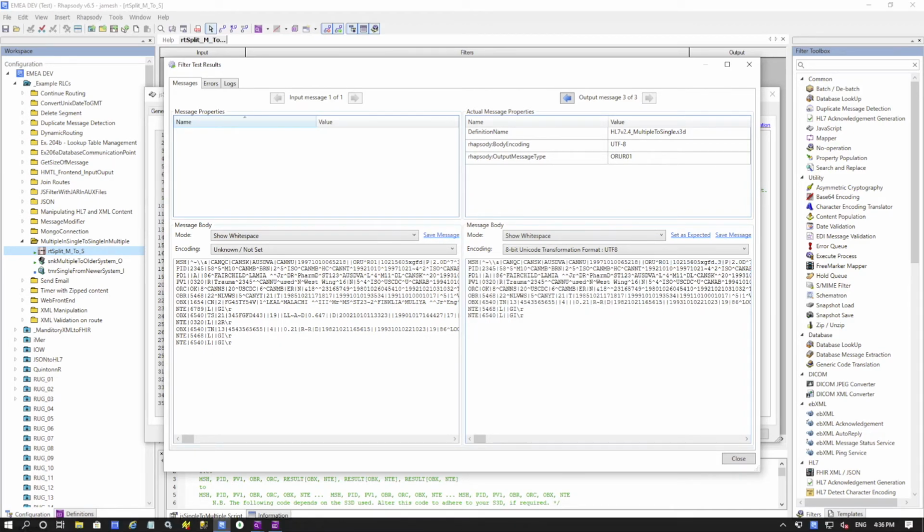These 3 messages that are created from a single message as an input on the filter will be released in order from the filter one at a time. Therefore, an input of one message will create an output of however many repeats of the result there are in the input message, meaning the downstream system will receive 3 single repeated items rather than one item with 3 repeats in, which it cannot handle.